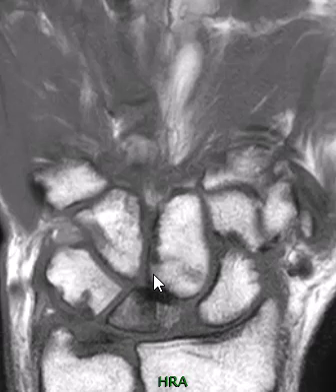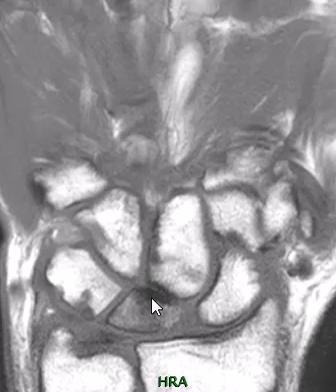And we see the capitate bone here. It looks like it has migrated proximally a little bit. We see this often when they have a ruptured scapholunate ligament and the joint is widened here and it can migrate down. And that may be sprained or partially torn, but it did not look like it was ruptured and it wasn't really wide. But we can see there's complete loss of joint spacing between the capitate bone and the lunate bone here. And there's some darkness, which is reactive bone sclerosis, all throughout the lunate bone.